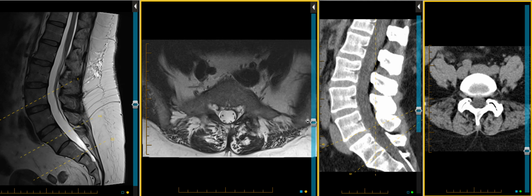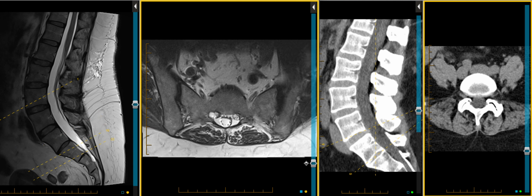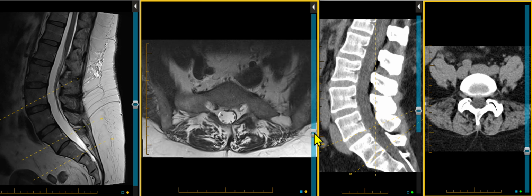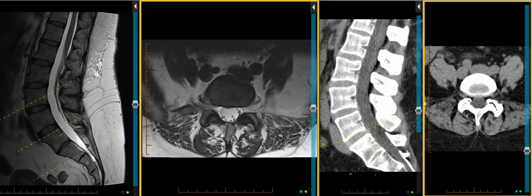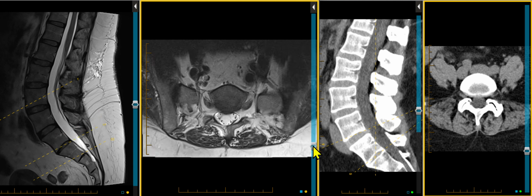What we're seeing here, again, you're seeing the accelerated facet arthropathy. Luckily, there's no significant neural impingement yet. But what we can see on the MRI scan very clearly is absolutely severe multifidus muscle atrophy, fatty infiltration, fatty atrophy, just really flaky muscle fibers down here in those deep stabilizing, intersegmental stabilizing fascicles of the multifidus muscle. And you don't appreciate that as much on the CT scan.